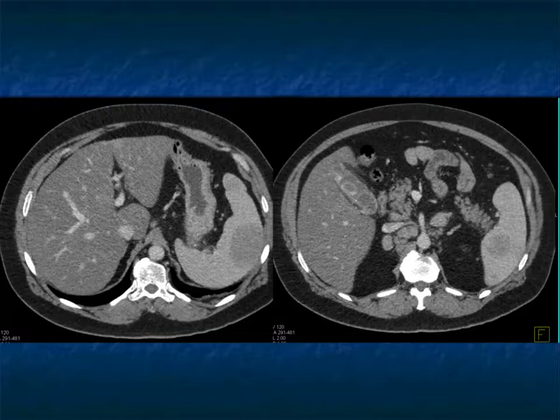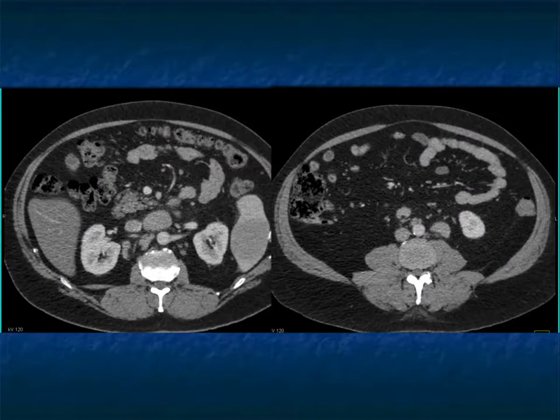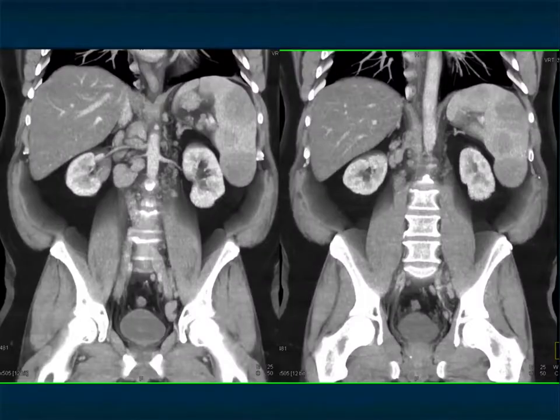Here it is on venous phase, where at times you see the adenopathy, but you can see how the multiple masses do stand out ever so slightly better. And here is just the lower extent of involvement with the adenopathy. When you look at lymphoma of the spleen, as in this case, the masses in the spleen are typically hypovascular. They're typically multiple, as in this case.